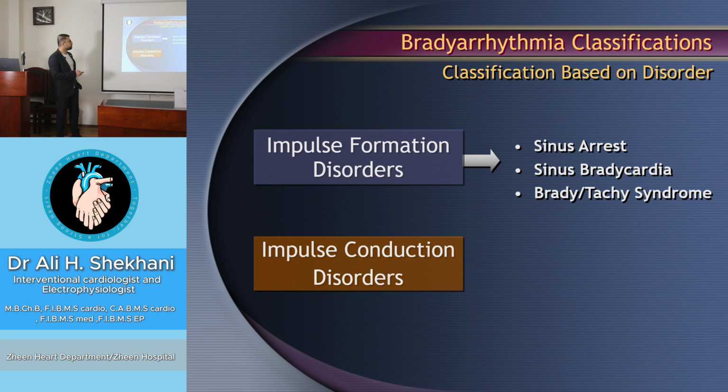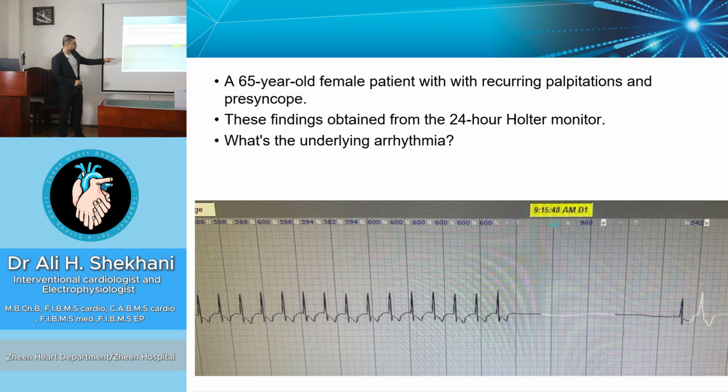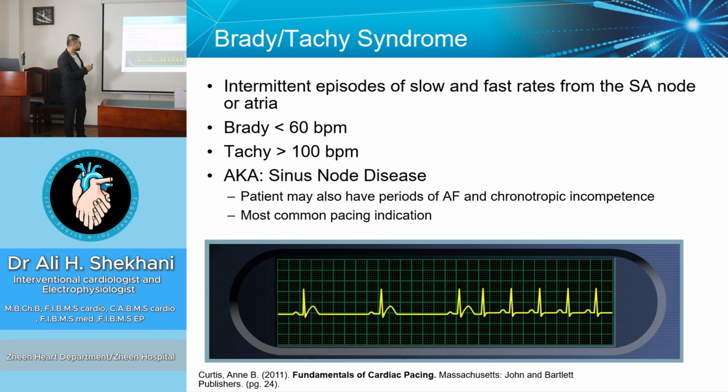The third problem is tachy-brady syndrome. As I showed you in this example, tachy-brady is also one of the criteria of the sinus node disease, the sinus node problem.